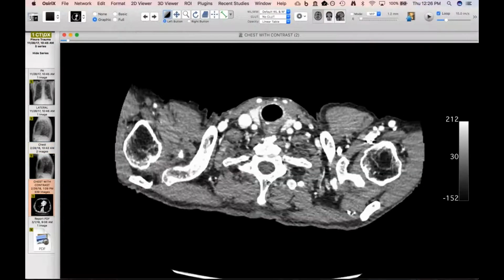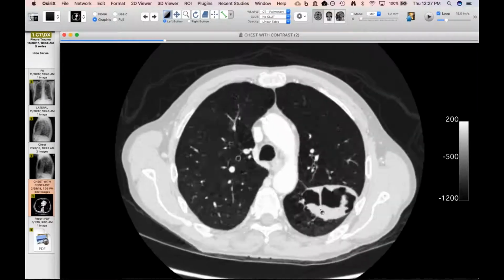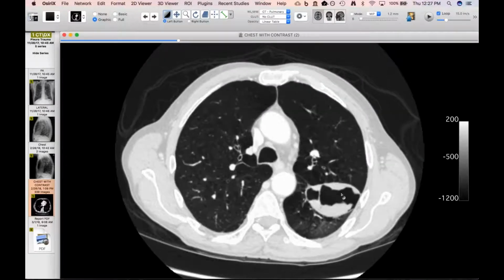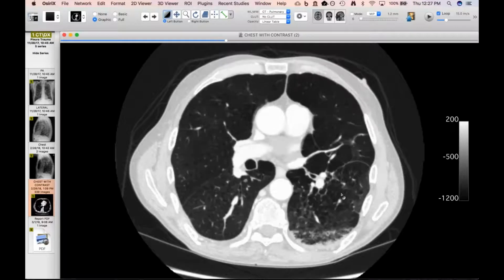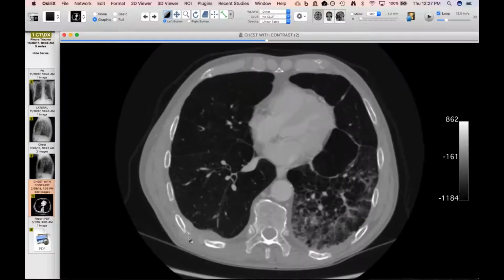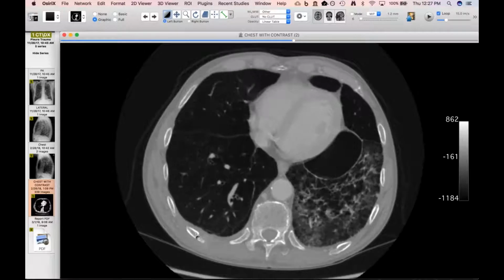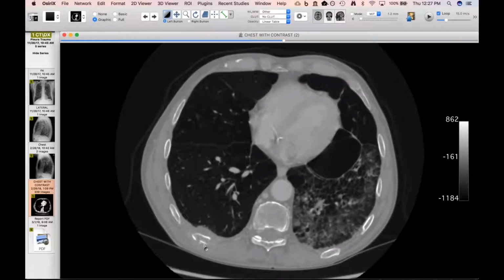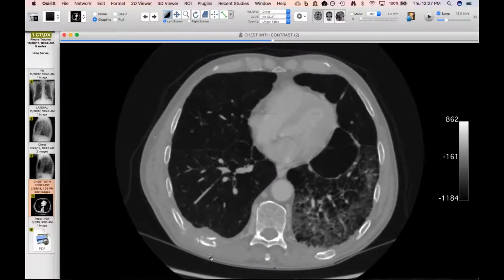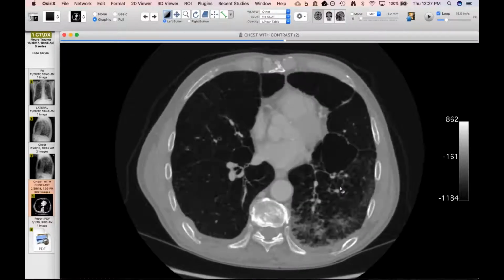So he underwent a subsequent CT, and I have my theory on what this thing is, because he definitely had trauma, and the history was that he had a little bit of hemoptysis the last couple of days. So with his rib fractures on the right, you see these little hematomas right here, and these look like they're still fairly acute. He fell about 10 days ago, hit his right side, and had been bedbound since then, and did not seek medical care until he started having hemoptysis. He had so much pain on the right that he just stayed in bed. Then he started having hemoptysis.